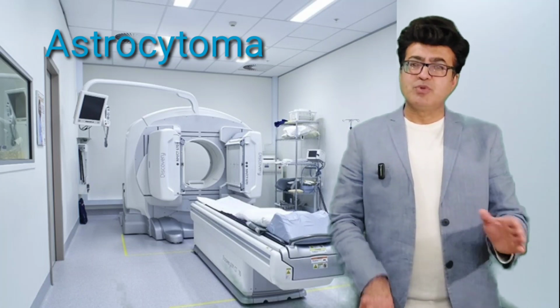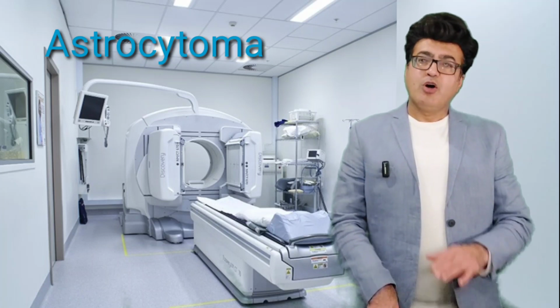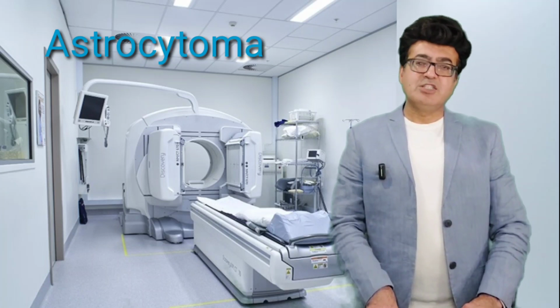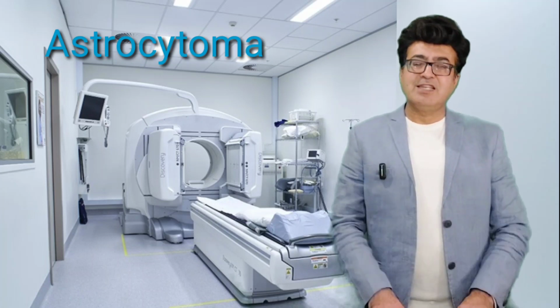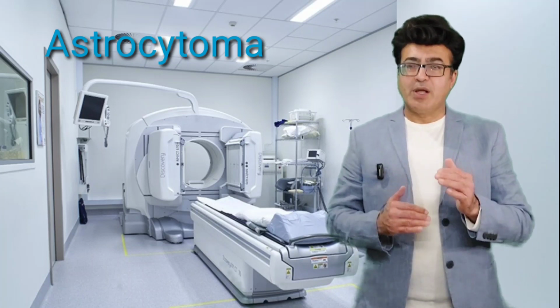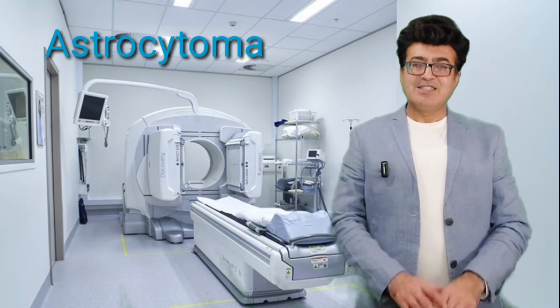Glioblastoma multiforme is usually seen at about 65 years of age, or in the older age group we can see GBM. So far as its radiological presentations and features are concerned, these consecutive slides will show you how we will be able to appreciate grade 1, grade 2, grade 3 and grade 4. So let's start these images.